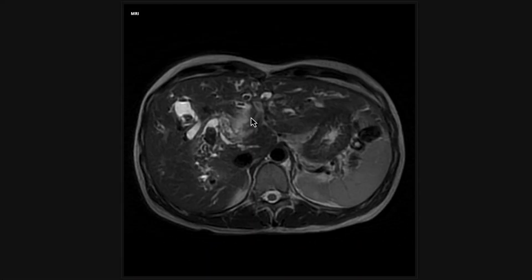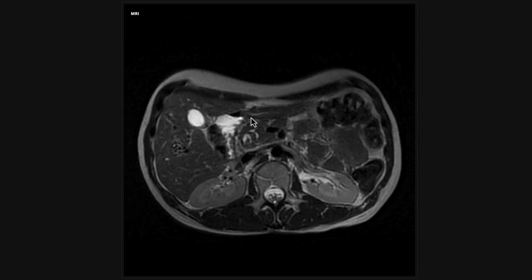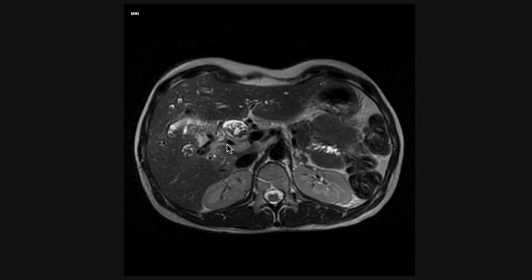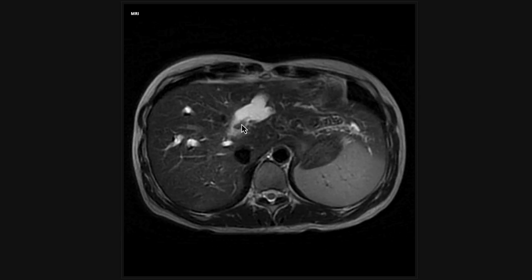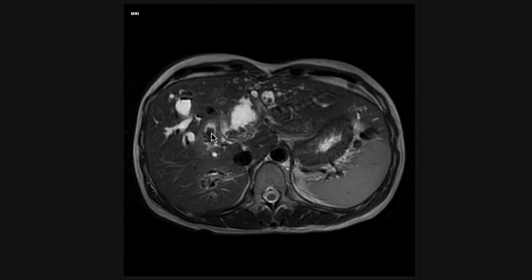For our next topic, we will review these MRCP images for a young female patient presenting with right upper quadrant pain and findings of sepsis. The biliary tree is markedly abnormal with areas of pronounced dilation and stricturing. There are also multiple stones filling the biliary tree.